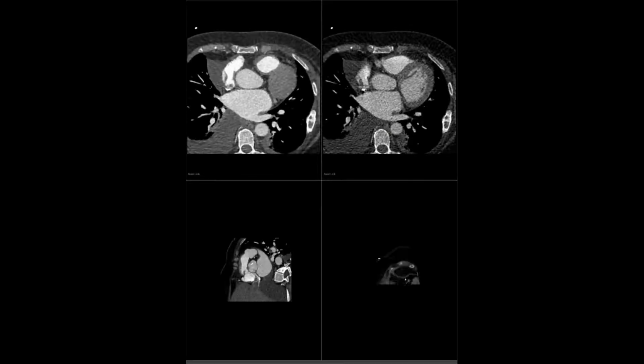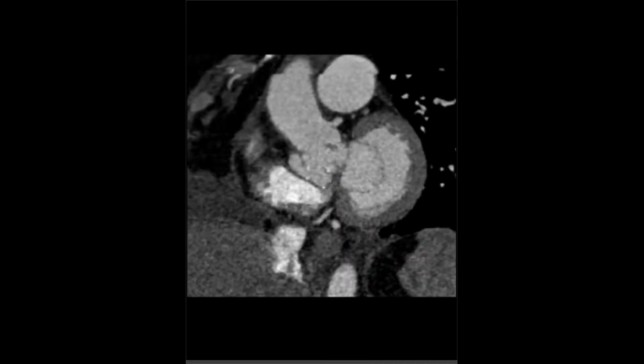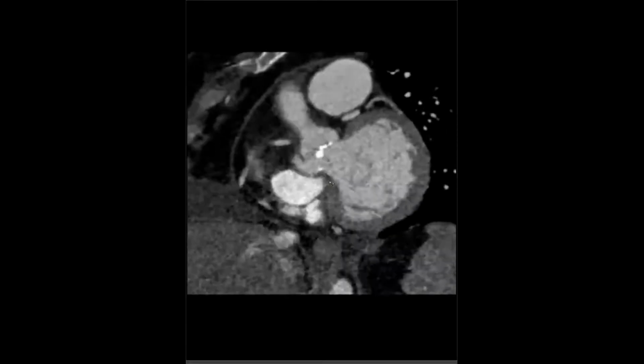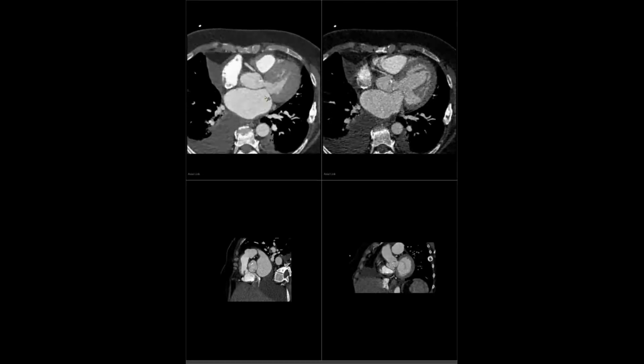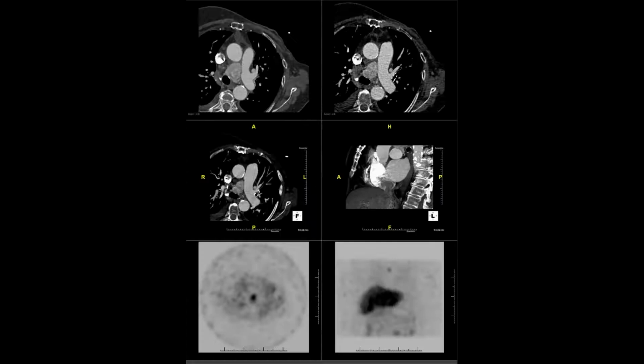And so she was actually referred to him for not aortic stenosis, but aortic regurgitation. And here on the long reconstruction, we can see that there's basically just a blowout of the wall of the sinus of Valsalva on that side. And it's actually also fistulizing above and below the valve plane. So this is a paravalvular abscess or contained rupture, which was unknown at the time of the CT. She didn't do well after that. I think she passed away shortly thereafter.